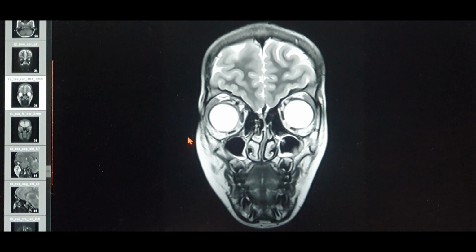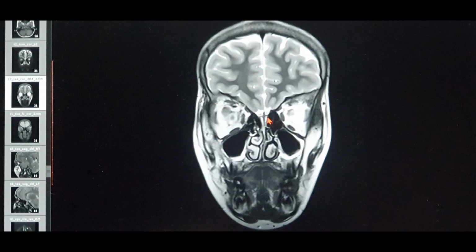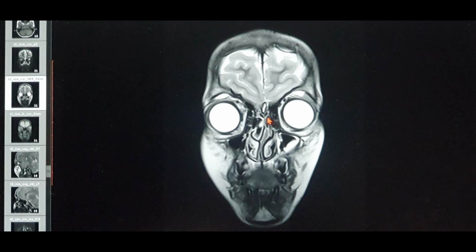We should remember that T1 is for the anatomy and T2 is for the pathology. So how can you identify a T2 as a spotter? If the examiner gives you an MRI scan and asks which sequence this is, and you get a scan like this, you have to give the answer as T2, because whatever body fluids are in the body appear bright white on the T2 sequence.